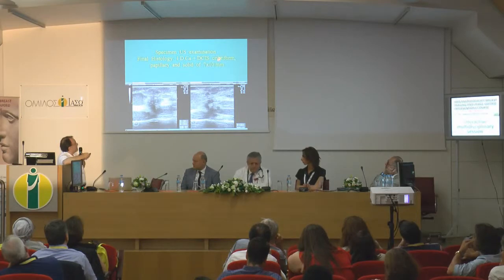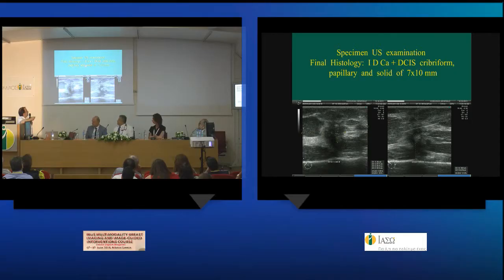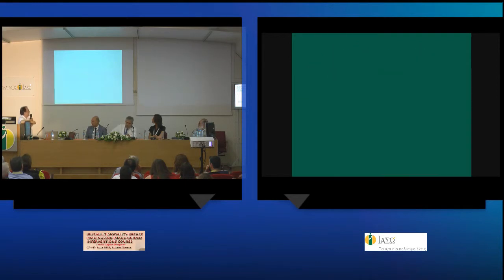Specimen of ultrasound examination, final histology: invasive ductal carcinoma plus DCIS, cribriform, papillary, and solid, of a lesion of 7 by 10 millimeters. It is the same as the ultrasound, and the ultrasound before did not see it. What it means is that many people play with ultrasound, not use ultrasound. This is very important.